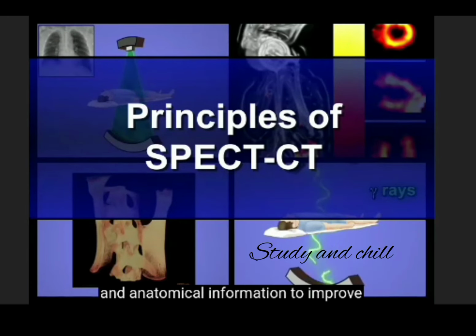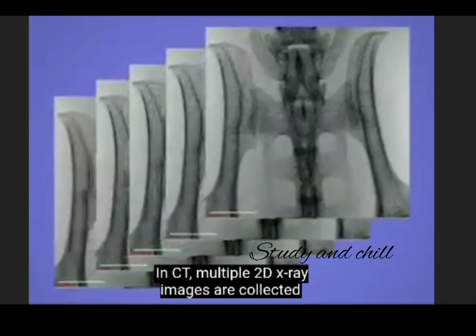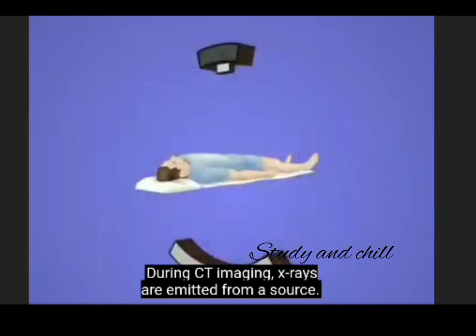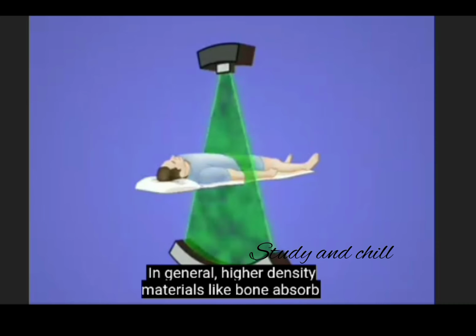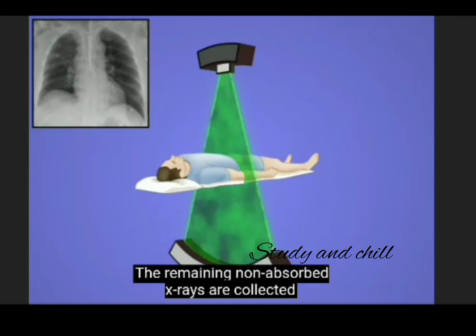In CT, multiple 2D X-ray images are collected to create a 3D model of the patient's or animal's anatomy. During CT imaging, X-rays are emitted from a source. As X-rays move through the patient, some of the X-rays are absorbed and the remaining pass through the patient. In general, higher density materials, like bone, absorb more X-rays than lower density materials, like soft tissue. The remaining, non-absorbed X-rays are collected by a detector placed on the other side of the patient that determines the intensity of the non-absorbed X-rays in Hounsfield units.